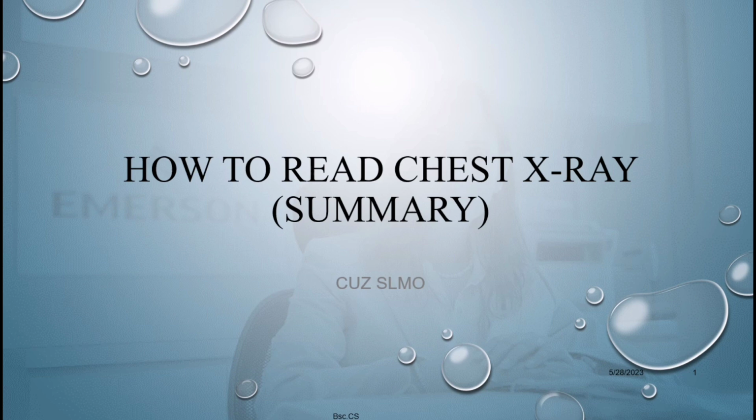Today we're going to also talk about how to read a chest X-ray. So this is just a summary. I'm sure by now you have an idea. When you watch this video, you should have an idea on how to read a chest X-ray. So this is a summary.